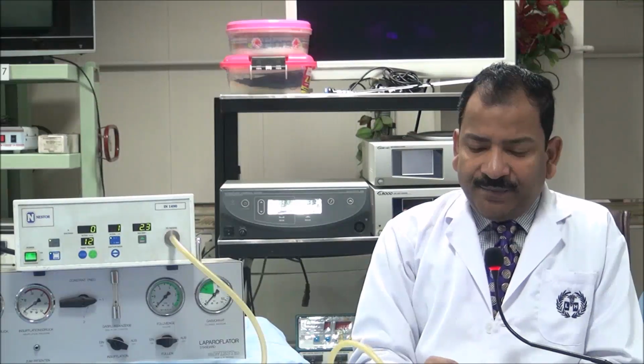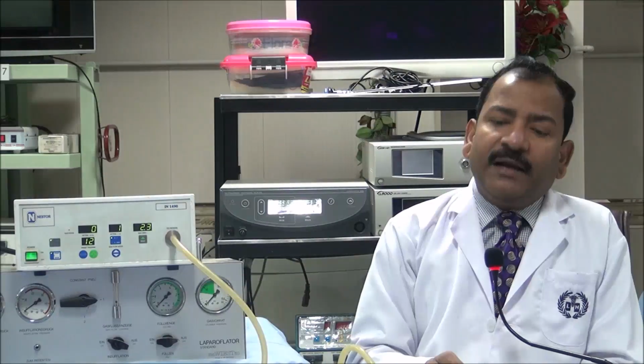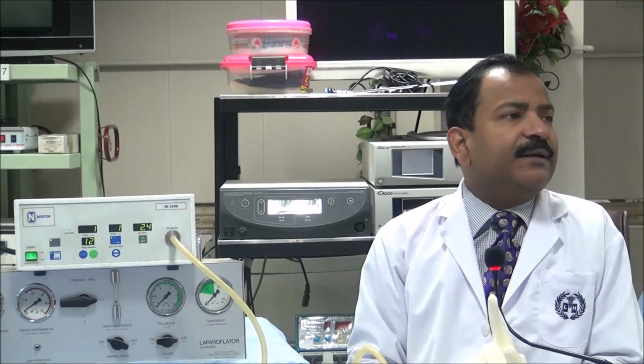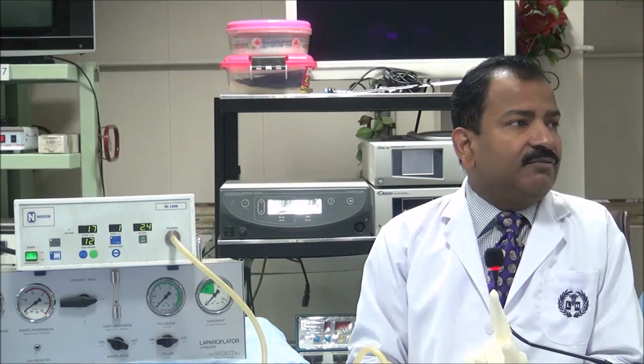So always remember, if you are putting in the Veress needle and there is a lot of fluctuation in your insufflator, then the upper reading should be ignored. You have to take care of only the lower reading. The minimum of the 5 readings is the actual pressure with the Veress needle. With the cannula, this error will not come. But with the Veress needle, this error is coming. Why?